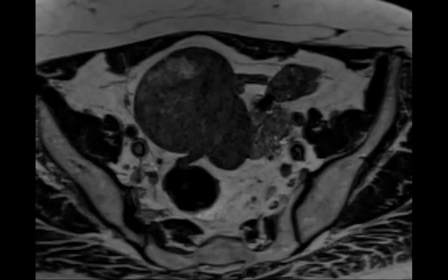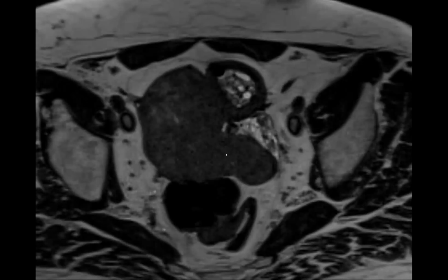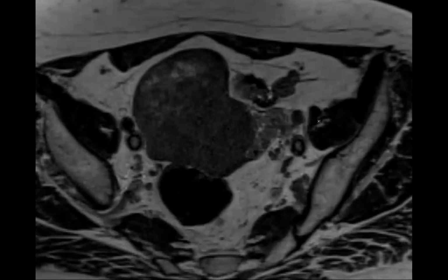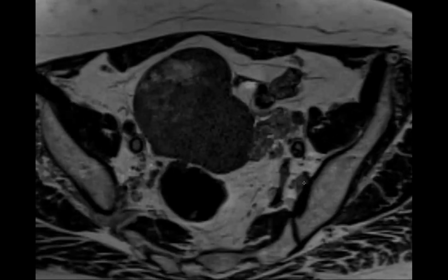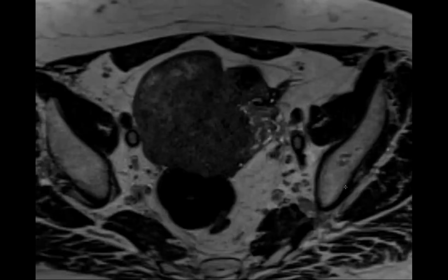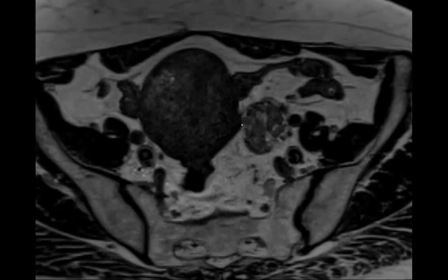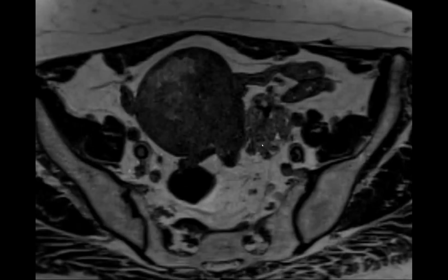One clue, first of all, she had sudden left lower quadrant pain. It's a solid mass with a pedicle to it. We were briefly like, is it a torsed fibroid, exophytic fibroid, right, with a pedicle? But we kind of favored that it really looked like more of an adnexal thing, and that these were engorged vessels. And then she had the effusion, so we called it a torsed fibroma, and that's what it was.